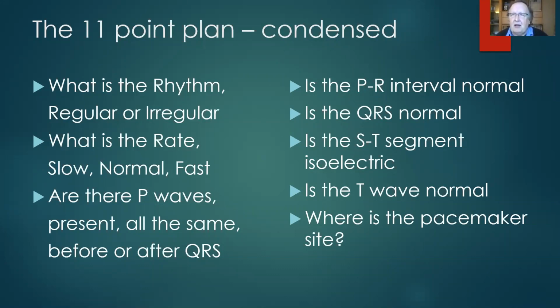We're going to look at the PR interval. This is the time where the atria contract, and then the ventricles start to contract. This is important for the time for the heart to fill up. And so we would look at 3 to 5 small squares, 0.12 to 0.20 seconds, which includes the internodal delay for the time of the heart to completely fill up. And later on, we'll look at heart blocks where there's a problem.